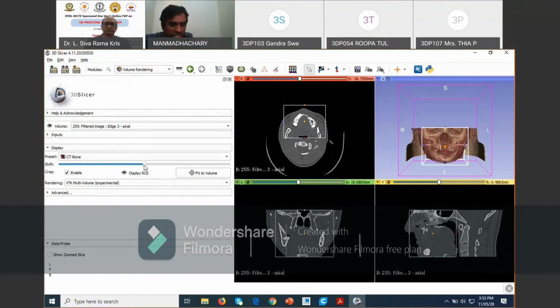Thereafter, go for the shift here. Sir, one thing I would like to ask. For cropping purpose, if I put the pointer on that particular point, then we can crop it. Okay. You have to click on that point and stretch it, that means drag it. Okay. That is the method only. After that, sir?